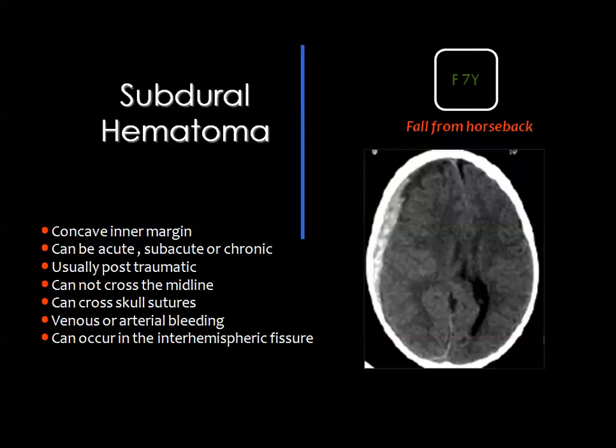And this is a subdural hemorrhage in a female child who has fallen from a horseback.